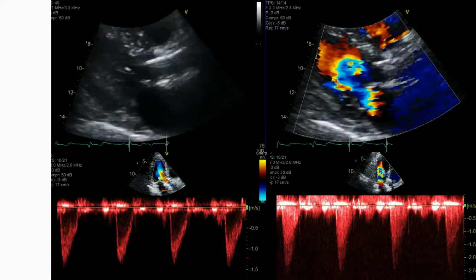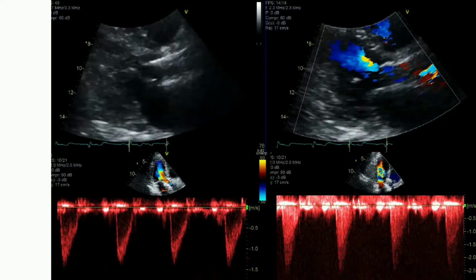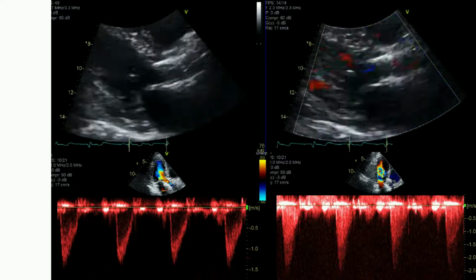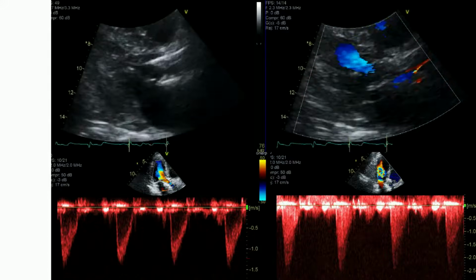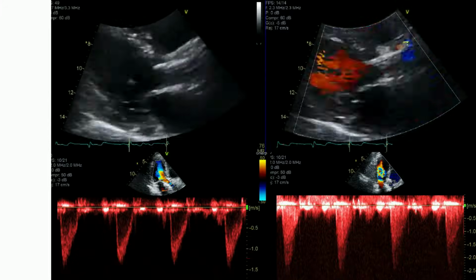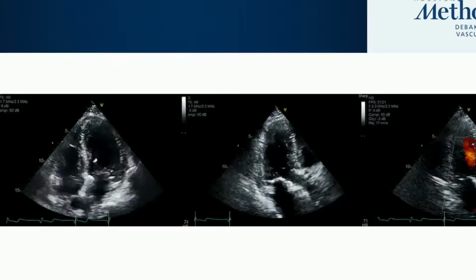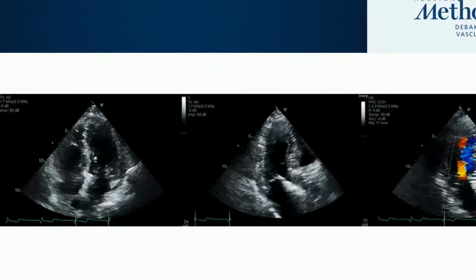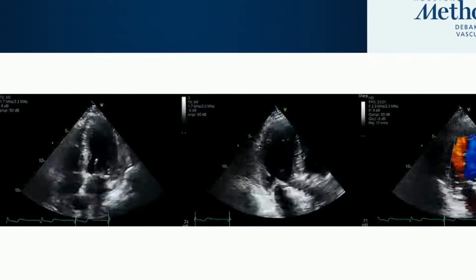This is his ECG, which showed sinus rhythm with poor R-wave progression in the precordial leads, but otherwise unremarkable. And this is his post-op day 1 TAVR echocardiogram, which shows normal LV function, a normal prosthetic valve in the parasternal long view with normal velocity and Doppler over the LVOT and aortic valve. Preserved LV and RV systolic function and no evidence of perivalvular leak.